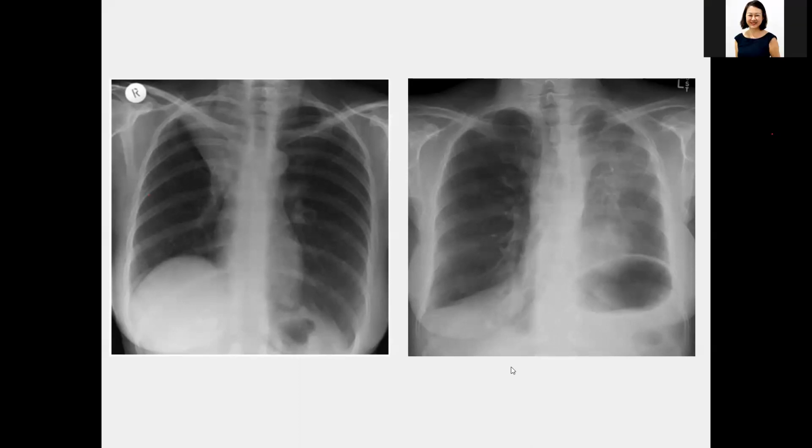So most have said right upper lobe collapse. Yes, it's correct. For this right upper lobe collapse, you always see an opacity at the right upper lobe here. This is the golden S sign, although it's not so S-shaped. But it's the golden S sign here. And you can also see an elevation of the right hilum. It's supposed to be lower down here, although the trachea is still not deviated yet.